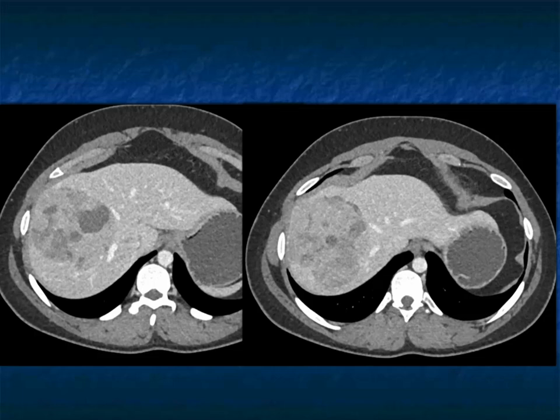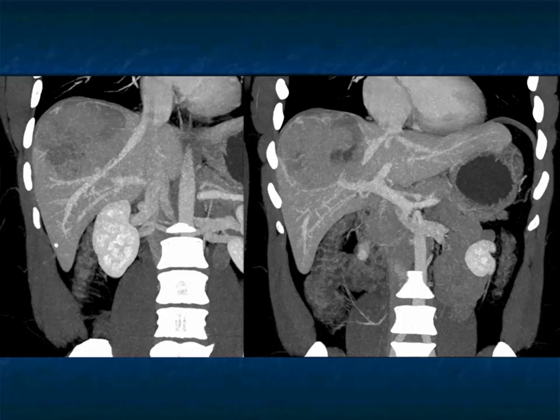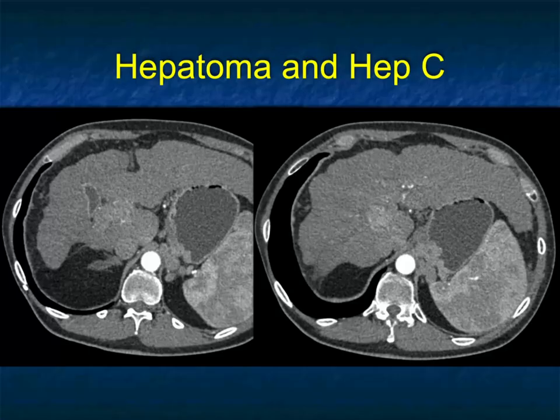If I said to you this was only hepatic adenoma, I think it would be hard for you to say this wasn't only hepatic adenoma. But once it bleeds, once it's irregular like this, you have to really worry, could you be dealing with a hepatoma? And eventually this was resected, which is the way you manage solitary hepatic adenomas that have bled. And this was a hepatoma on pathology, really nicely showing you the mass effect on the veins.